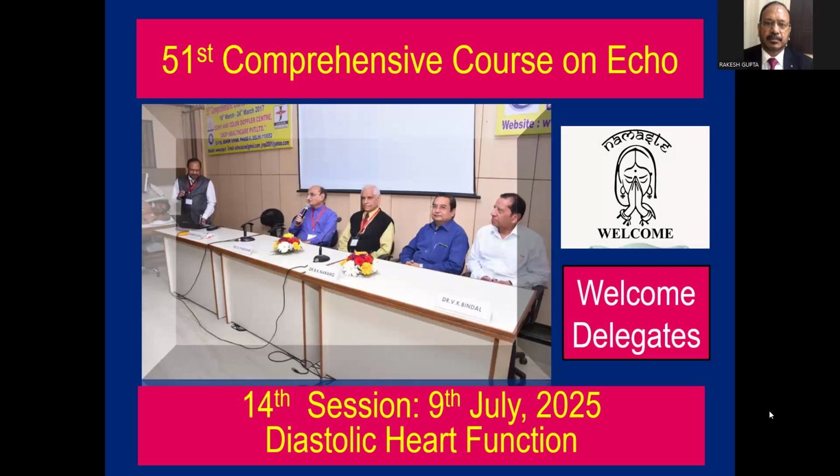So let me show you a couple of examples of cases where you can see wall thickening abnormalities.